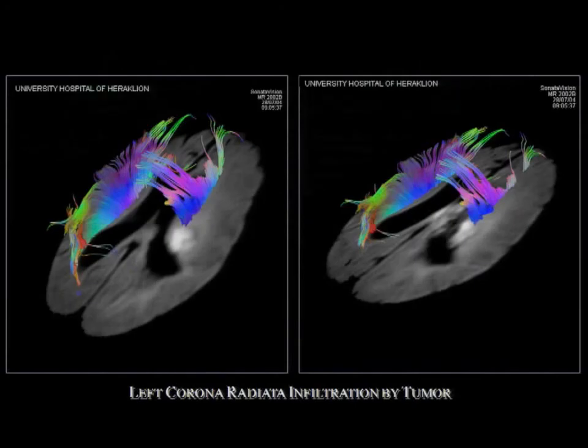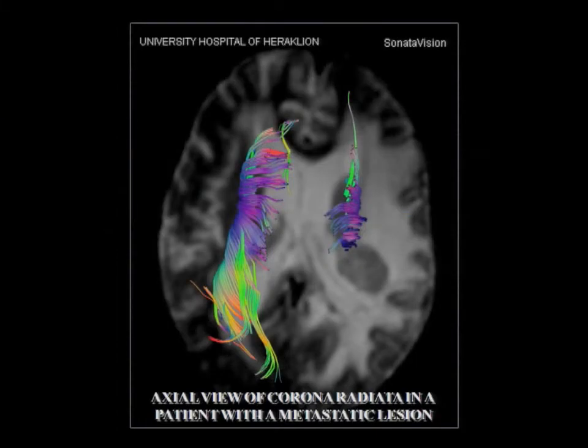From our department, another infiltrating tumor with destruction, infiltration of the corona radiata here, as you see, and another tumor, a metastatic disease with the destruction of the fibers. Fiber tractography is a very fascinating and promising method, but keep in mind that it has many limitations. It's difficult to resolve crossing fibers. It's a user-defined process, and keeping this in mind, we can use this knowing the limitations and the potentials.